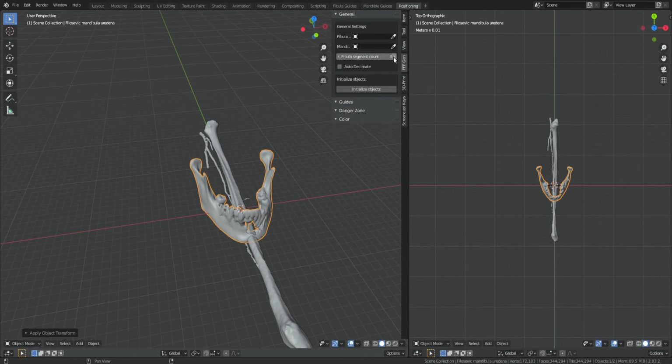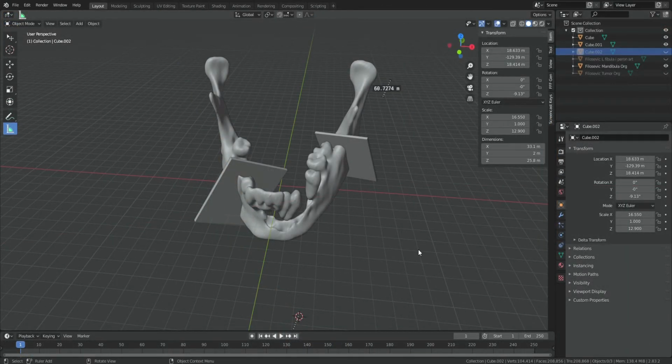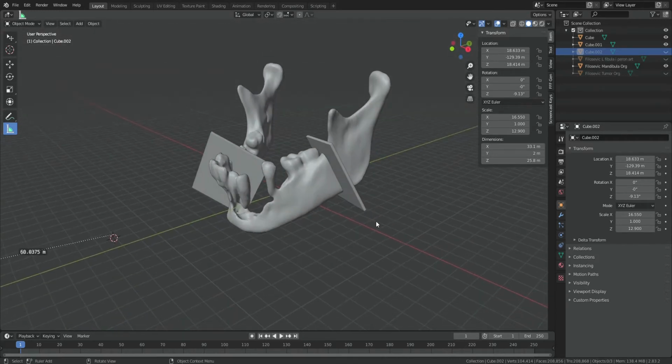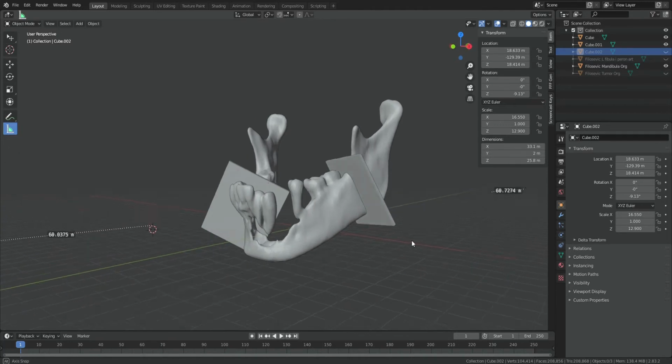Go to FFFGen. You choose mandible for mandible, fibula for fibula, and this is the plan for the patient that we discussed together this morning with the surgeons.